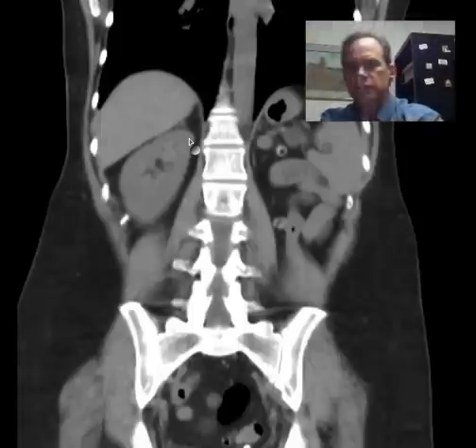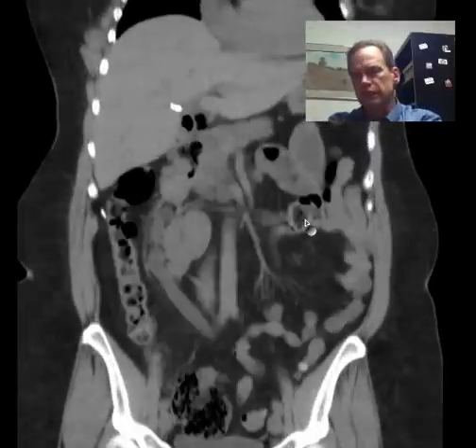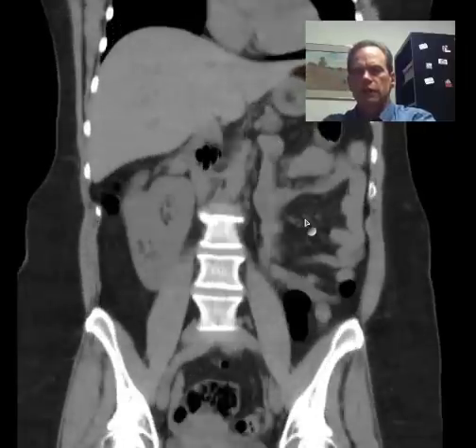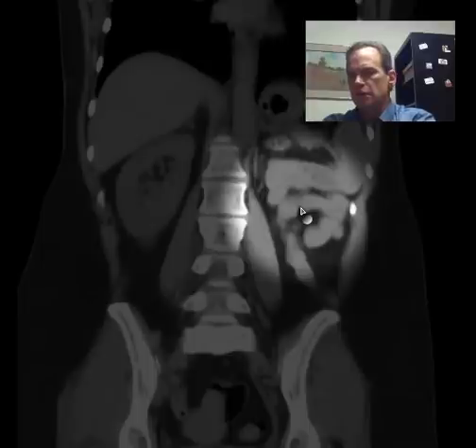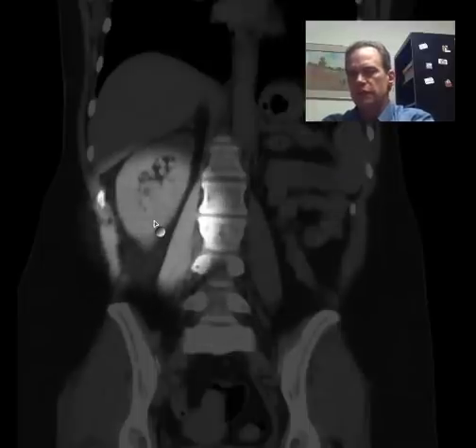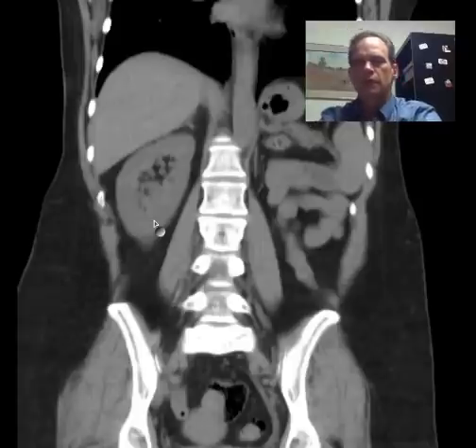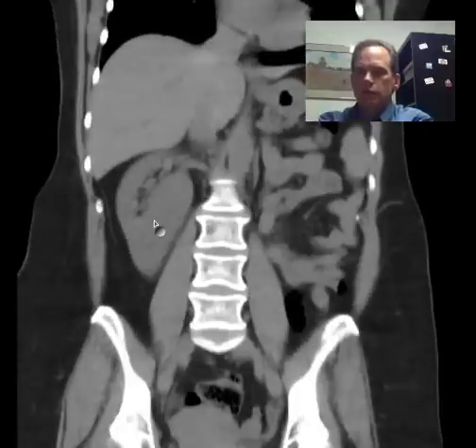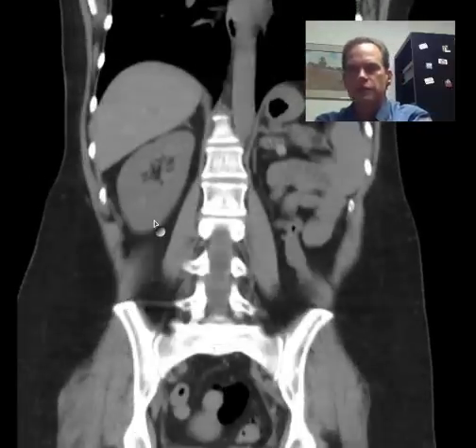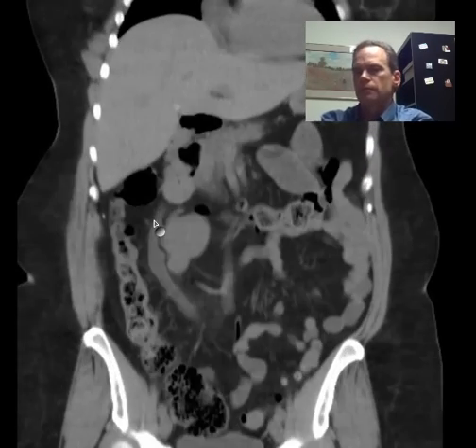So if we look at this case, you'll say, you've got a really long kidney on one side, and we don't have any kidney on the other side. Well, it seems to me that maybe the left kidney has moved over to the right side, where it doesn't belong, and just joined at the hips with the right kidney. Well, that's pretty much the situation here, and we don't phrase it in that manner in medicine. We call it crossed fused renal ectopia.